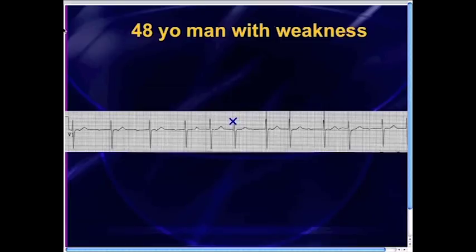And as we've said many times in the past, whenever you're debating between Mobitz 1, Mobitz 2, and third degree, where do you need to look to find the answer? You simply look in the PR intervals. And what we discovered here was that the PR intervals were gradually lengthening, and then you've got the P wave which is not conducted.